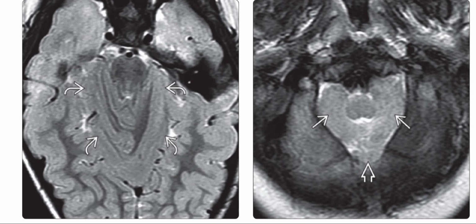In these images, we can see that the image on the left is the axial T2 weighted MRI at the posterior fossa level. It demonstrates the classic axial image manifestation of the towering cerebellum extending through the wide tentorial incisura. The right image is the axial T2 weighted MRI, which is performed at the foramen magnum level, and it depicts the characteristic crowding of the inferior posterior fossa. Both of the cerebellar tonsils as well as vermis are inferiorly displaced into the foramen magnum.